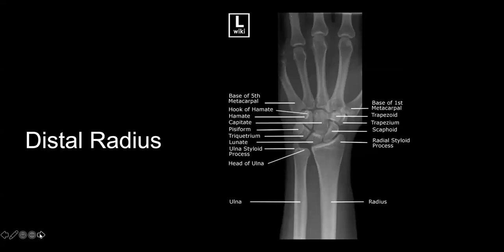Fractures of the distal radius are a very common presentation to A&E. And the common history you'd expect to hear is an elderly patient falling out on an outstretched hand, and that's given in the acronym FOOSH. So if you see FOOSH in the clinical notes, that's what it means. Again, super common presentation and definitely something you want to be familiar with in terms of recognizing on images.